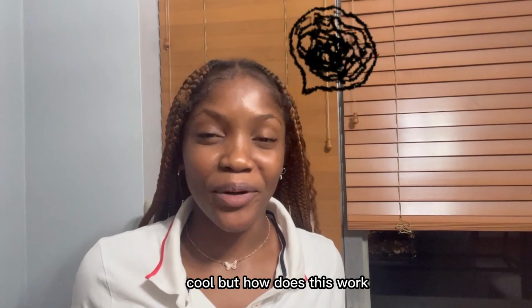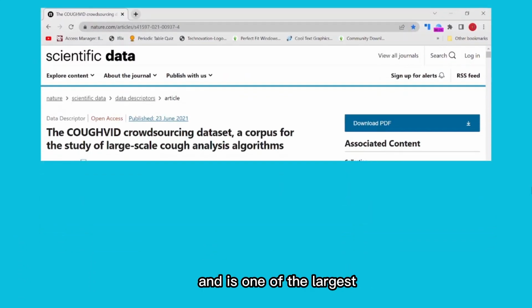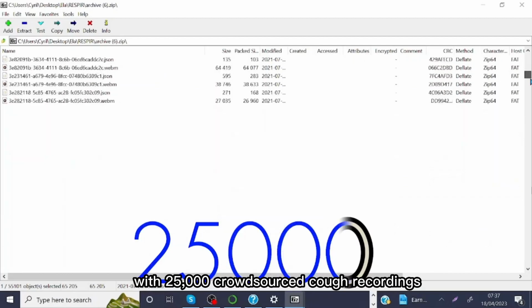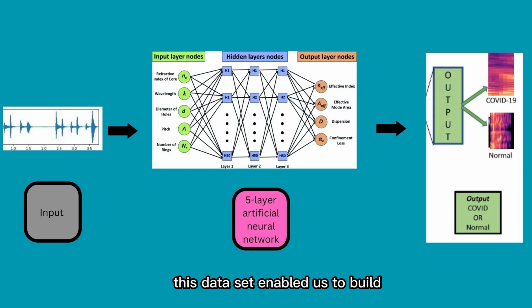Cool, but how does this work behind the scenes? Our dataset, CoughVid, was sourced from nature.com and is one of the largest expert-labeled cough datasets in existence, with 25,000 crowdsourced cough recordings. This dataset enabled us to build a reliable model in 5 main steps.